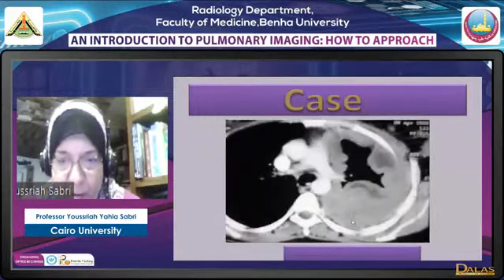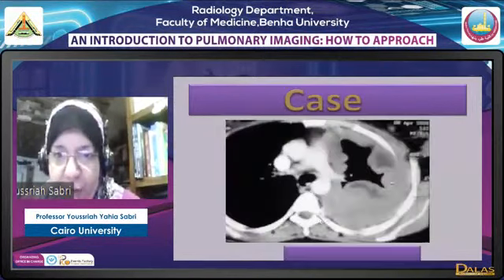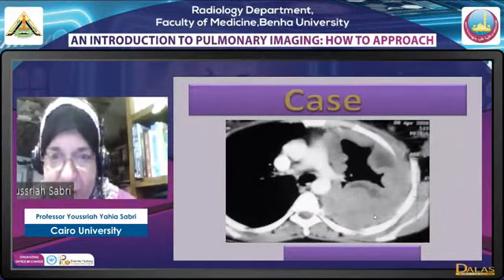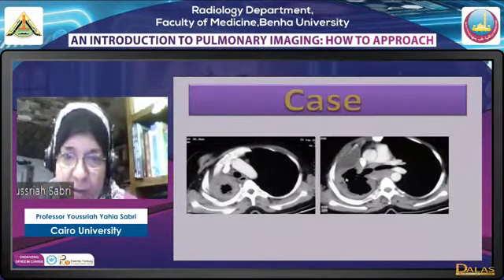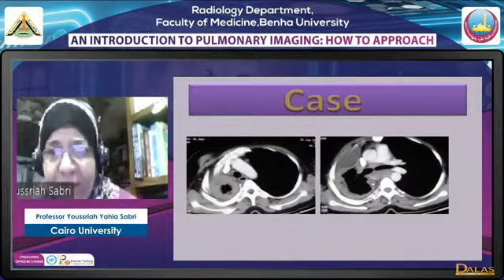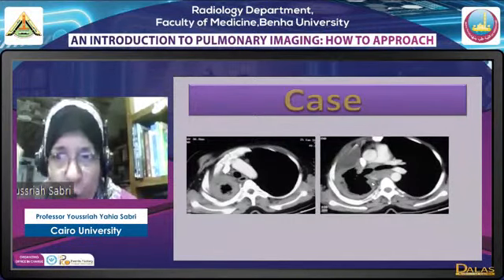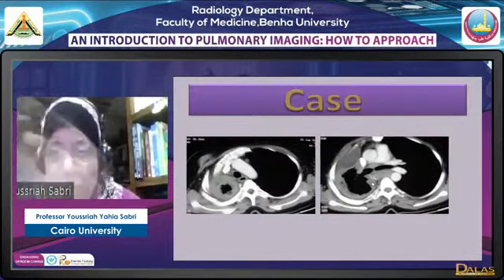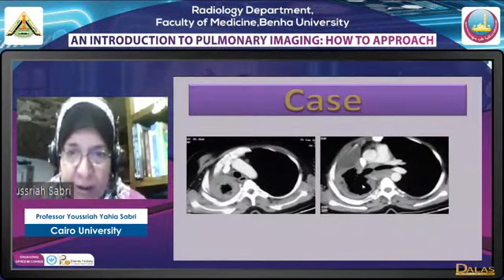Here we have circumferential nodular thickening on top of an asbestos exposure. This will suggest that we may have a mesothelioma. Here on the other hand, we have the typical appearance for a radiologist of a mesothelioma, which is circumferential nodular thickening of the pleura. Another nodular appearance with decreased volume. By the way, a mesothelioma may be associated with decreased volume, which is a classic pattern, or a normal volume, or even an increased volume if it is associated with a mass effect and effusion. So the volume change has nothing to do with it.